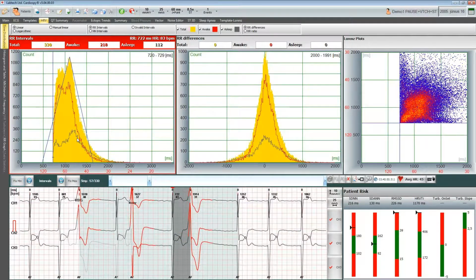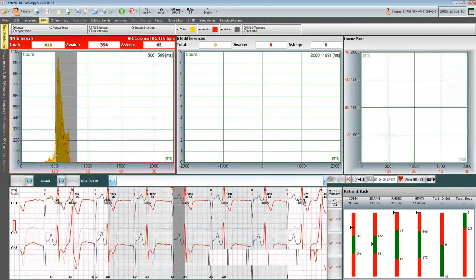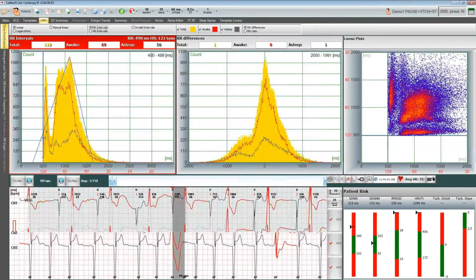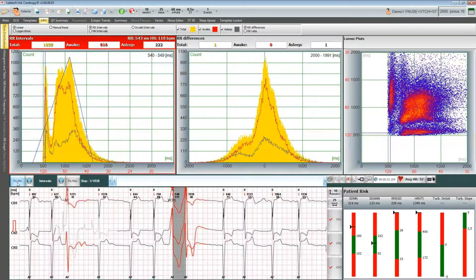The best thing with this graph is that you can also undo your editing by making the invalid intervals valid again using the same method. So you can also fix previously deleted intervals.